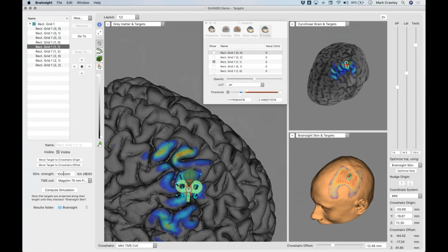It's a good reference for how to calculate what this stim strength is, or how it's going to be, relative to the stimulation strength that you're using. If not, use this figure that's in already. Use the default figure and just use it as a reference.